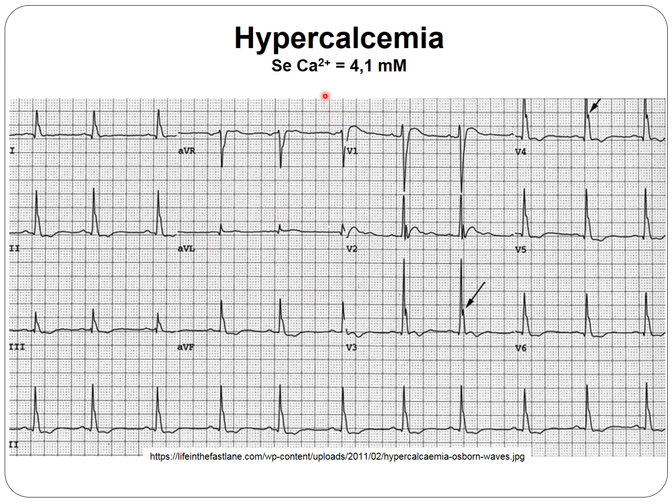In another case with an increased calcium concentration, again the rhythm is regular. It is sinus. The P is normal, PR is normal. The QRS is about 120 milliseconds, borderline, but let's say it's widened. The axis is normal, around 60 degrees. Pathological Q wave, none. Hypertrophy, none. And we do see a notching at the end of the QRS complex, as the arrow shows. So that's hypercalcemia with the Osborn sign, Osborn waves.